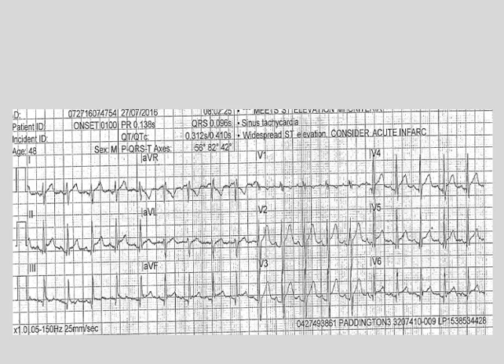Let's look at this one. Let's accept that it is tachycardic. I think that's the first thing that stands out. In terms of axis, we wouldn't worry about that too much. There are P waves and they're regular and they're paired. I think mostly, yes, every now and then there's a possibility of a slightly different RR distance, but your calipers would confirm that.